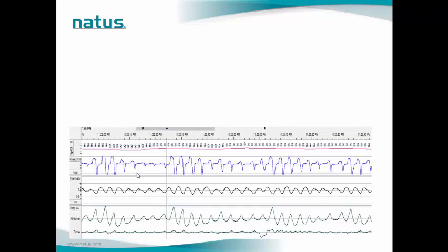This is the same example that we explained in the previous definition, recommended 1A. And here we ignored the arousals because the criteria doesn't rely on associated arousals.